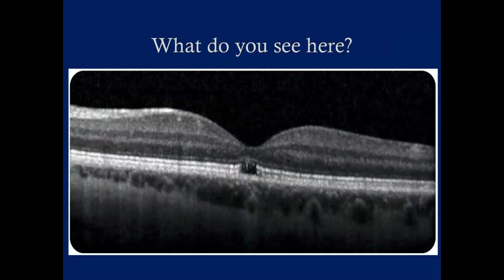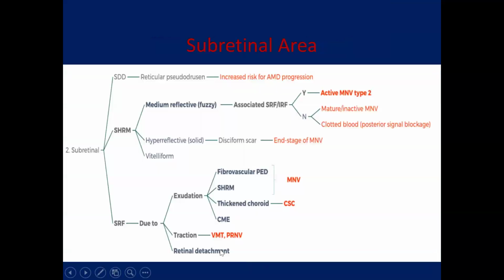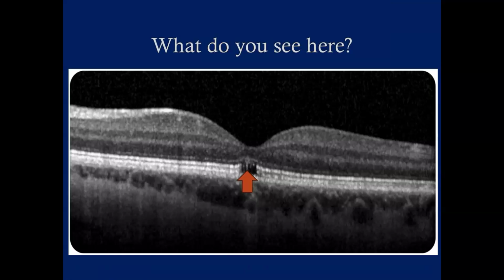So, what do you see here? Anybody? Here. What do you see here? Sorry? Anybody wants to comment?